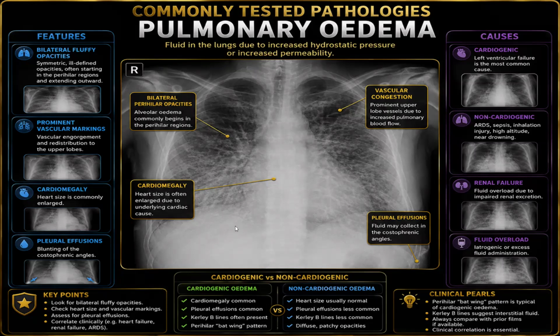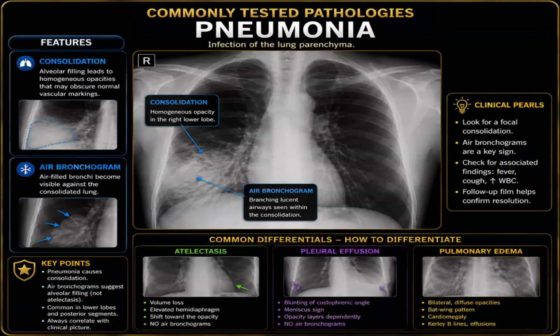Okay. How to know it's cardiogenic or non-cardiogenic? If you find these findings without cardiomegaly, non-cardiogenic. If you find the cardiomegaly, it means cardiogenic. Easy? Until proven otherwise, until you do echocardiography to confirm. What is the problem here?